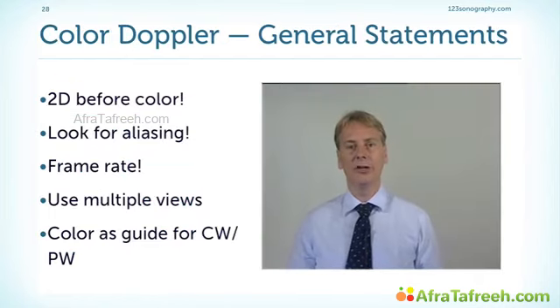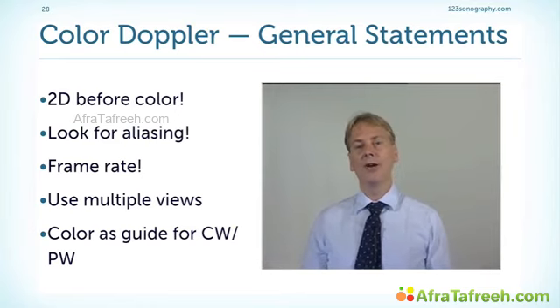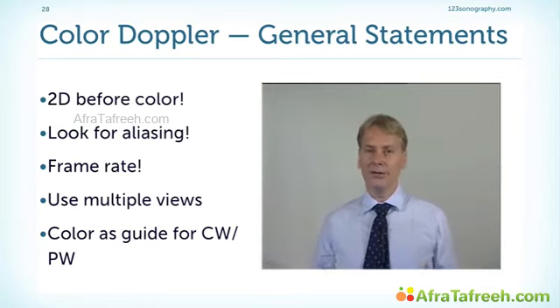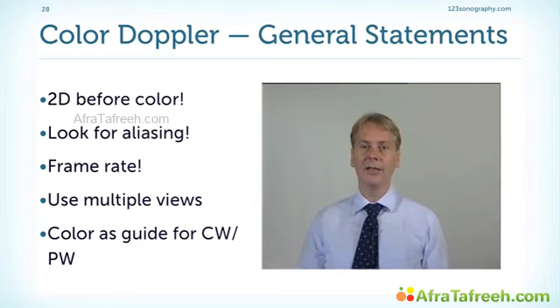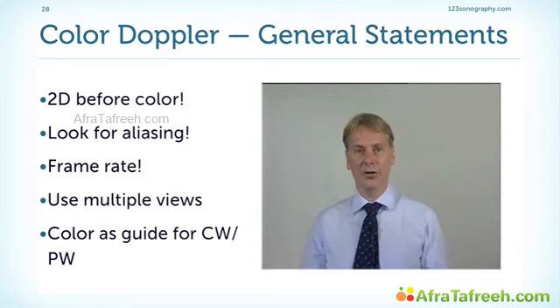Now let's turn to color Doppler. Color Doppler, no question, is very important. However, I have the impression that the color Doppler is probably used too much, especially if you learn echocardiography. It has its place, but my impression is that you should probably stick with the 2D image first and try to get the morphologic information you need, and then turn on the color.